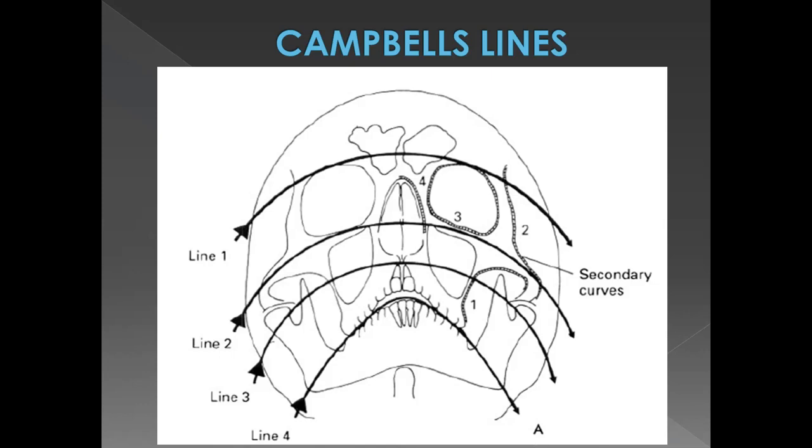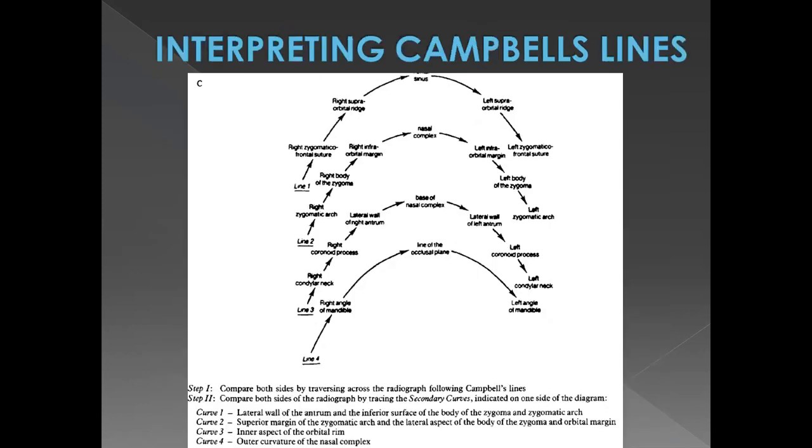Other than the Campbell's lines, there are also other secondary curves which are not very clear over here, so I've just put in a separate slide. This is just the interpretation of the Campbell's lines, which I've already explained to you. So you can go through this when I share the video, inshallah.